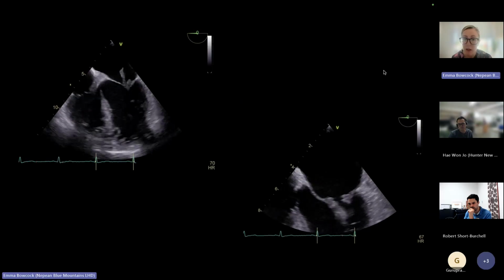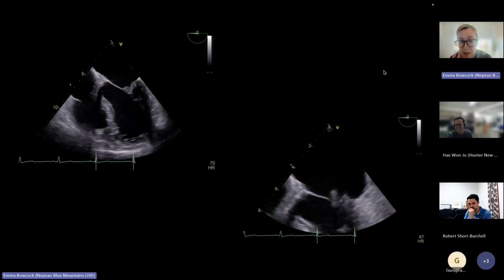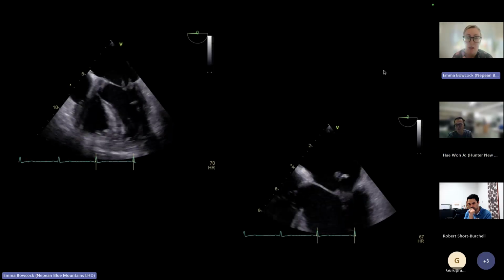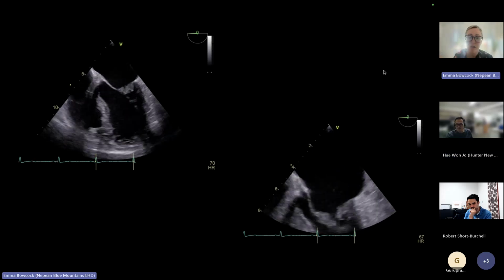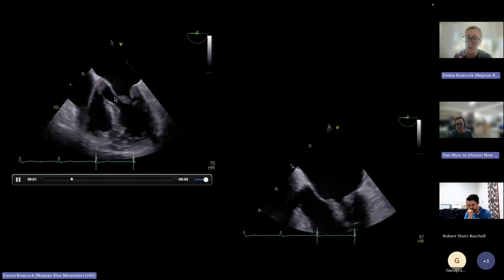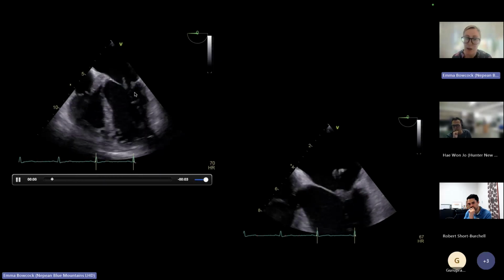In the Viva, we might interrogate you about LV walls and LV function, as well as the scallops of the mitral valve that you're looking at, so probably interrupt you a little bit more. When you're in a 5-chamber, you're generally seeing A1P1. Then as you come down to a proper 4-chamber, it's A2P2, and then push in further, where you start to get coronary sinus and things, that's when you see A3P3.